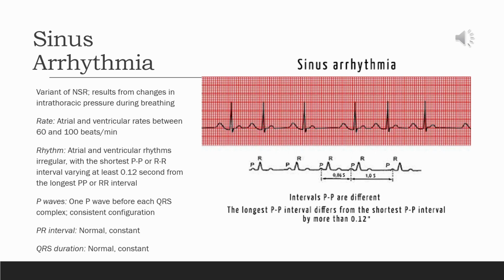So while a respiratory sinus arrhythmia is common and usually harmless, sinus arrhythmia can also be non-respiratory and triggered by certain medications like digoxin or even morphine, which can enhance that vagal tone and slow the heart rate. So in these cases, the irregularity is not related to breathing. So if you see a sinus arrhythmia on an ECG, we need to consider the patient's clinical presentation. If they're young and healthy, this is likely going to be a normal finding. However, if this patient is on medications that affect heart rate, or they have an underlying cardiac concern, then we may need to have some further evaluation.